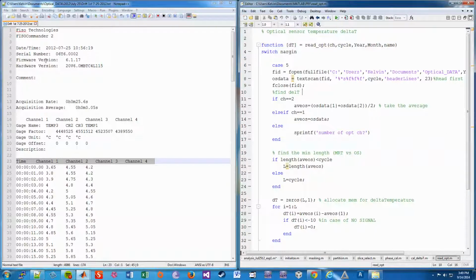This can sometimes depend on the comments section, and this is going to change and then output an error, so be aware of that. You can always change the starting point by changing this number right here to whatever row the headline starts at.